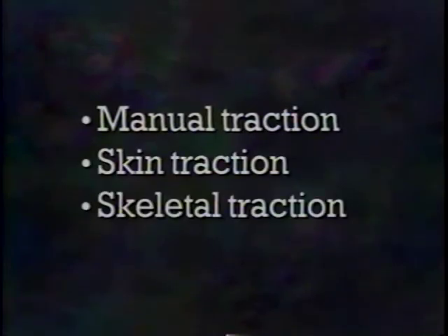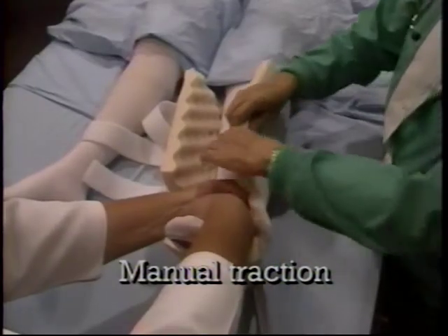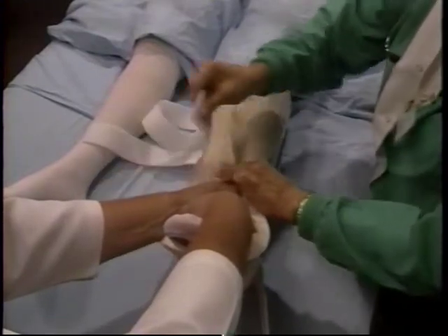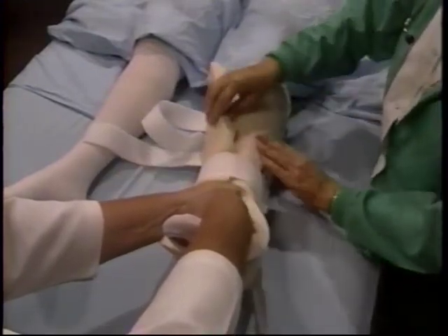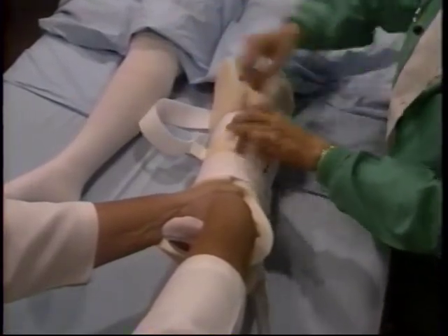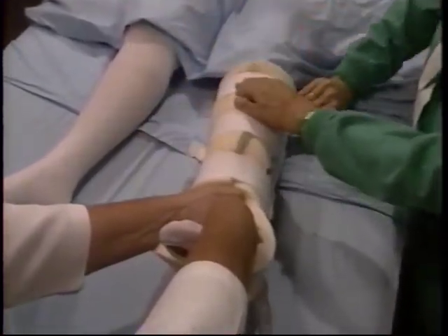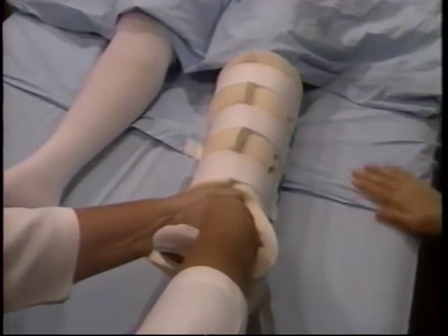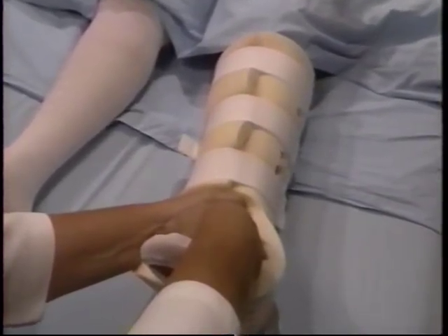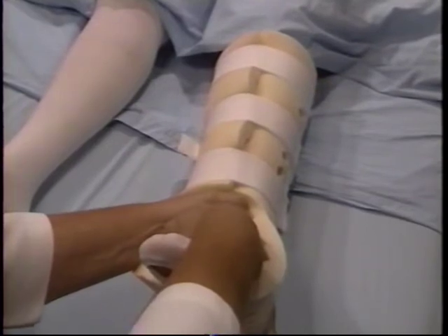There are three basic types of traction: manual, skin, and skeletal. Manual traction is applied by using the hands to exert a pulling force on the joint or limb which is to be realigned. It is commonly used during the application of a cast or to reduce a fracture while mechanical traction is being applied or readjusted. Manual traction should be applied smoothly and firmly and is supervised by a physician.